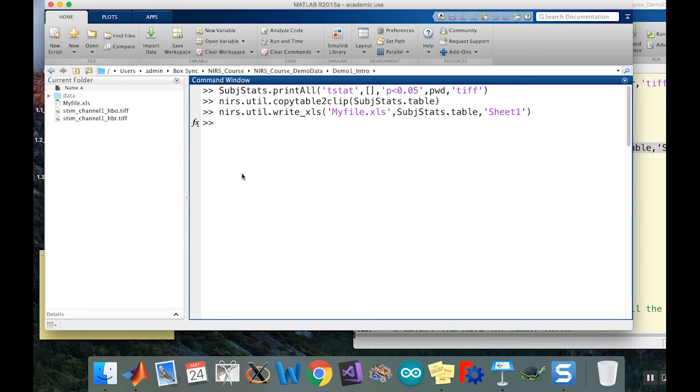What it lets you do is actually create sheets. So we can create these Excel files, storing that table, and then if I wanted to, I could create one sheet for every subject or something like that. It's actually a really nice function for dealing with that, particularly if you have a Mac where you didn't have those right Excel commands.